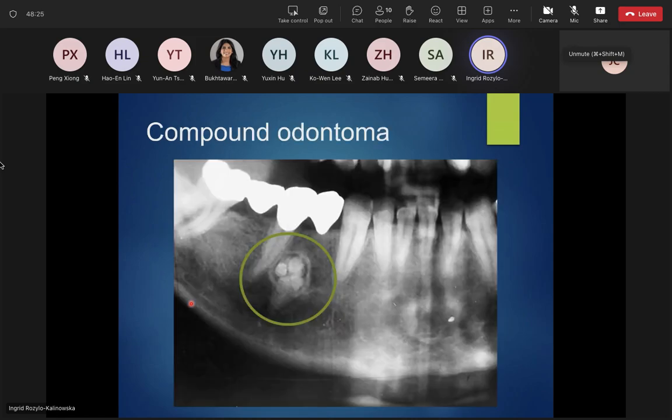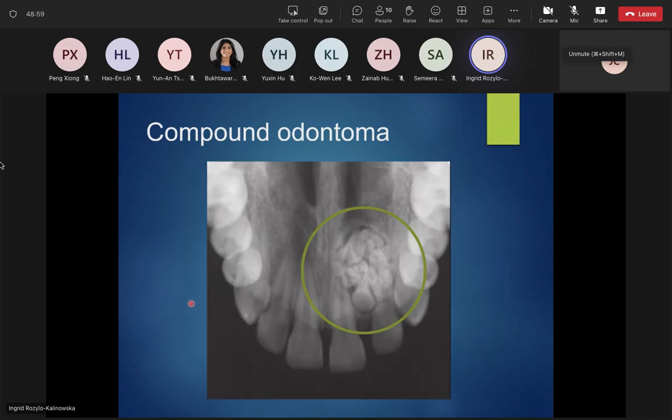So, in fact, when you see an odontoma, it's going to be quite characteristic. So if you observe tiny incorrect teeth surrounded by a capsule and surrounded by a sclerotic rim, then with a high probability you can say that this is an odontoma, which is in a way good news for the patient because it's always benign.